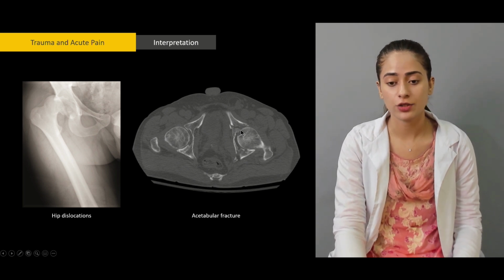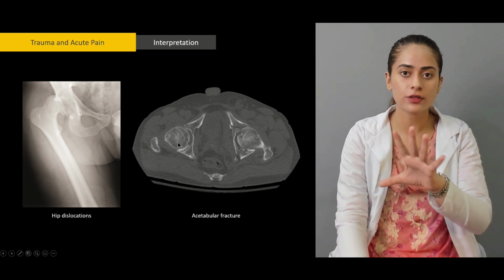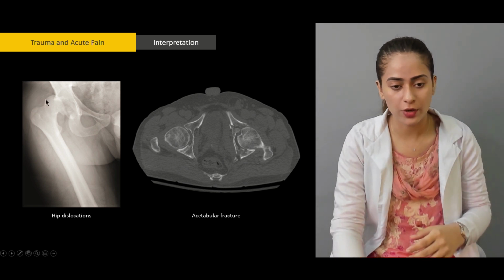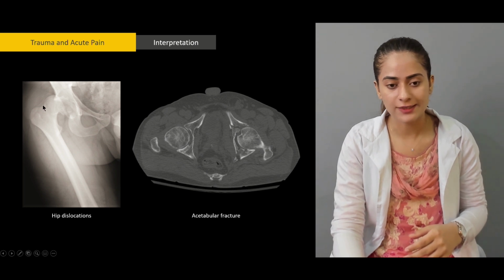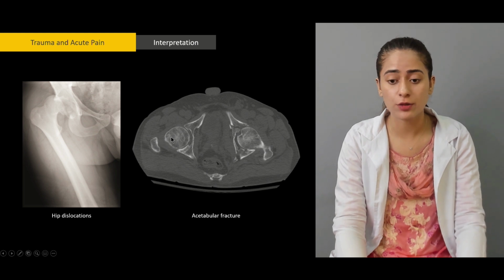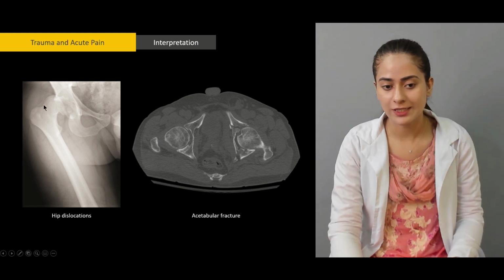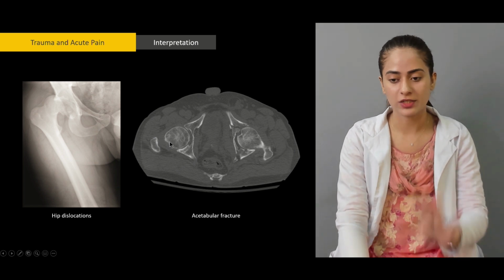What's happening here is that you see the femoral head and the greater trochanter. Because this slice doesn't really show their connection, it's not like the connection is not present. It's just a little bit below this point. This is not part of the slice, so it is not visible. These are actually joined together, the greater trochanter and the femoral head, but the joint is not visible here. I hope that's clear. It is present, but underneath here.